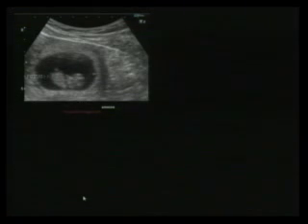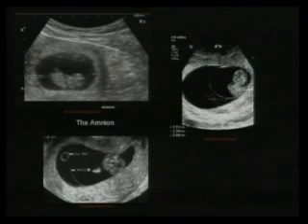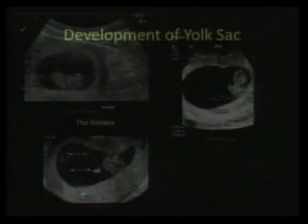All right, so some examples here. So here's our fetus. Here's our amnion. So basically, this is our amniotic membrane right here. Again, here you see it here. So here's the fetus, here's the amnion. Again, eventually this is going to expand out and it will actually fuse later. So here's a nice example here. So here's the amnion and here's the yolk sac. And again, remember this amnion is going to slowly expand over time and eventually it's going to fuse with the outer surface of the chorion.